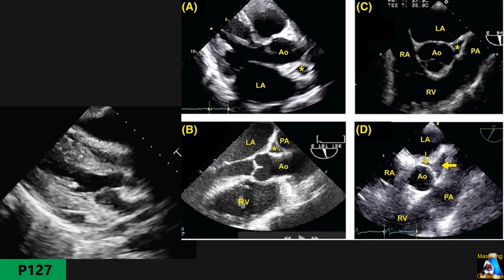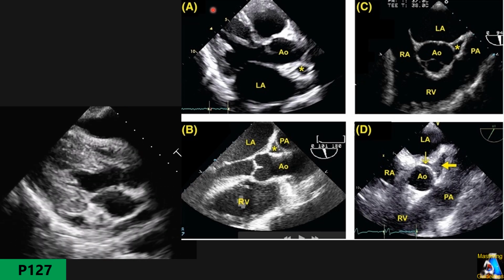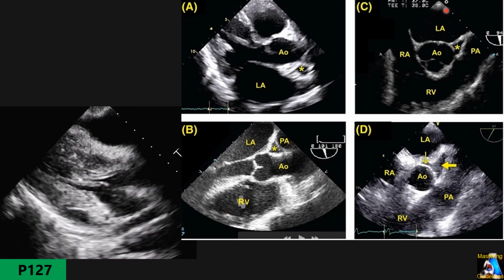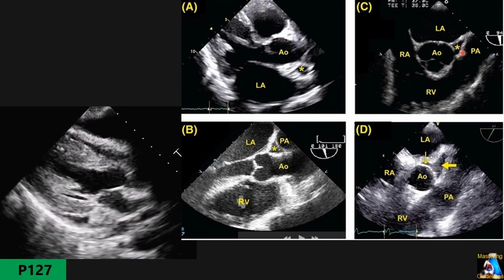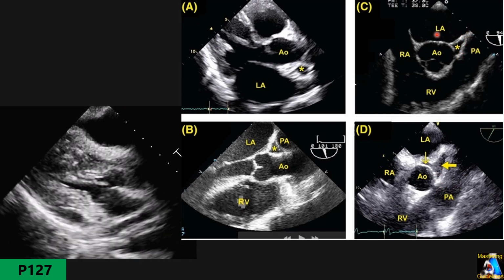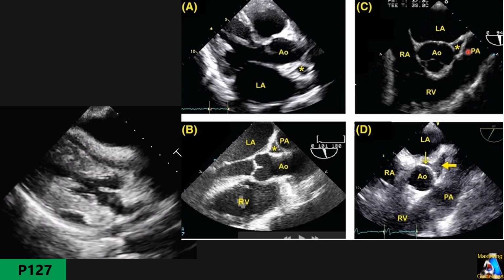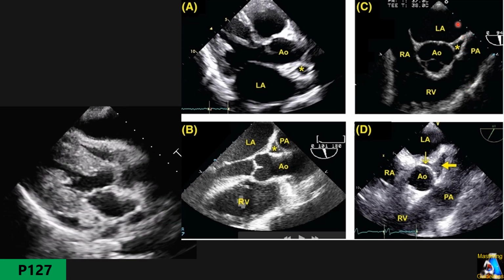Here we have some of those recesses, but here only the sinus I show. Here we have both on TEE. You can see here the transverse sinus. Here the same. You have to not be confused with the left atrial appendage or auricle. How do you know? The appendage opens to the atrium.